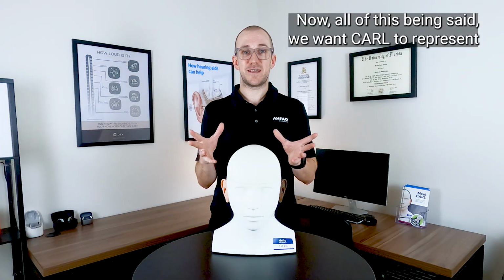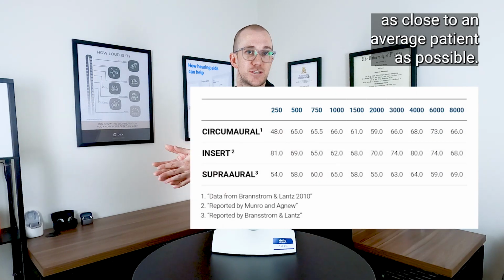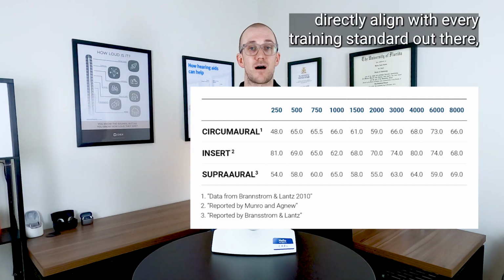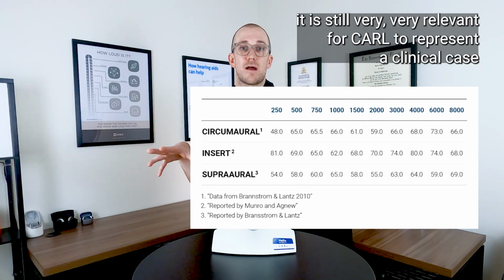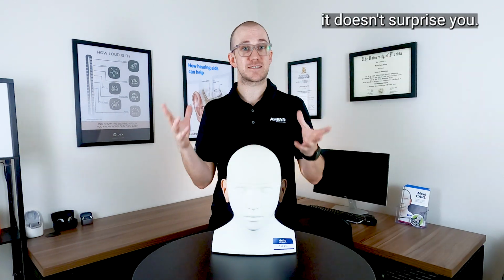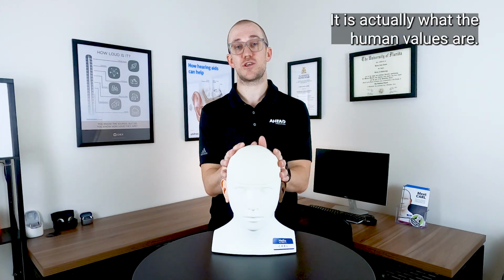Now, all of this being said, we want Carl to represent as close to an average patient as possible. This means that the interaural attenuation values here are what has been researched in the literature. And even though they don't directly align with every training standard out there, it is still very relevant for Carl to represent a clinical case, so that when you first get to clinic and you see this case, it doesn't surprise you and it's not different than the training standards. It is actually what the human values are.